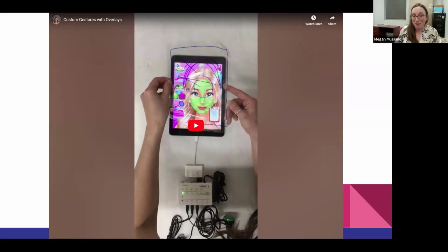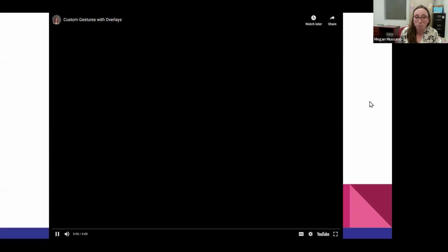So that's the programming. I mean, that really is just an overlay and a permanent marker, and you can start to make everything accessible. Now, as discussed, you cannot make this whole app accessible. But let's say there's 10 minutes of free time, and maybe we program the first thing in the top left corner of every one of the makeup things for the student, and then her peer support or somebody else, during social work or whatever activity, other people can use other turns. So sometimes you just have to be choosy about what you want to make accessible as you go.